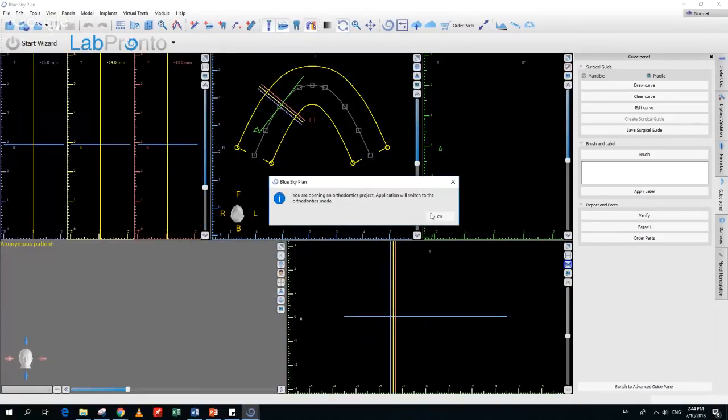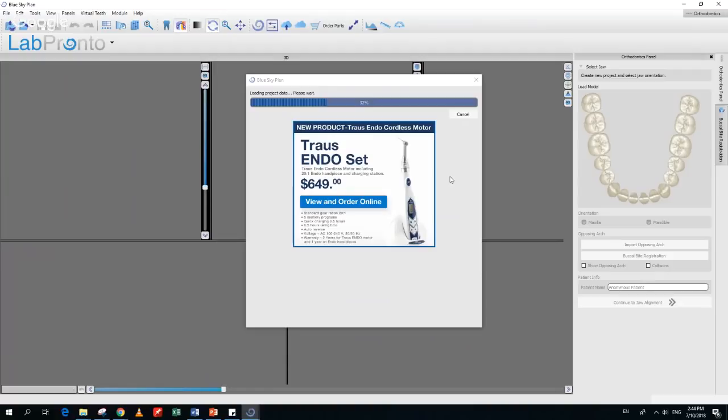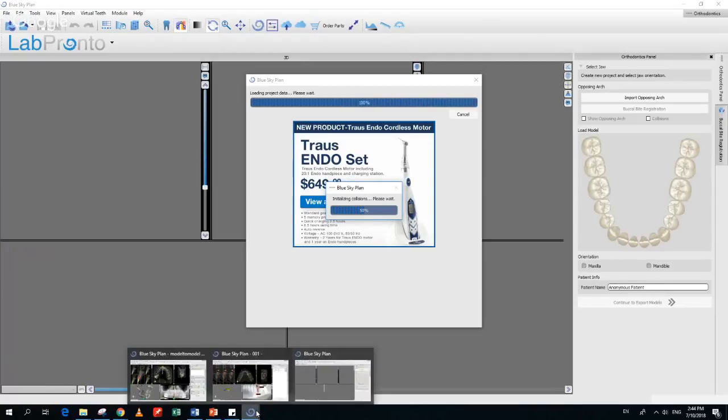We're going to switch to the orthodontics module. And we're not going to even take a look at the case, but just so you see the process flow, we placed the order, we got it back. Very, very convenient. Okay, I was going to show a case regarding impression inversions, but we showed the process flow in a previous webinar regarding inverting an impression. So because we're already out of time, I'm not going to go into that during this webinar presentation.